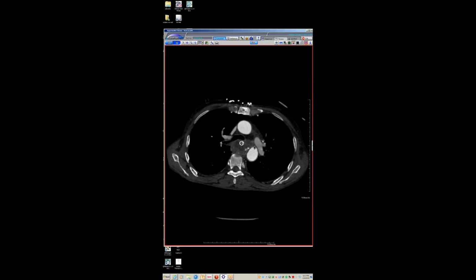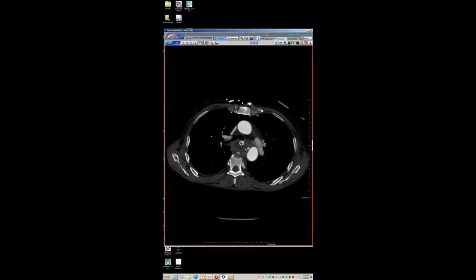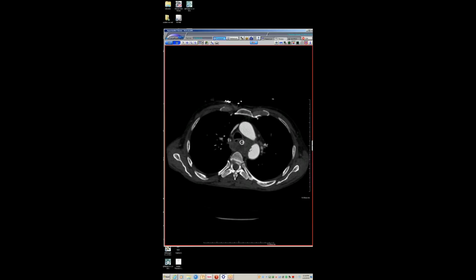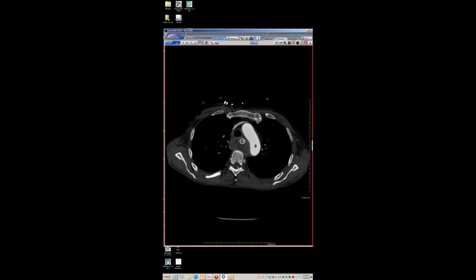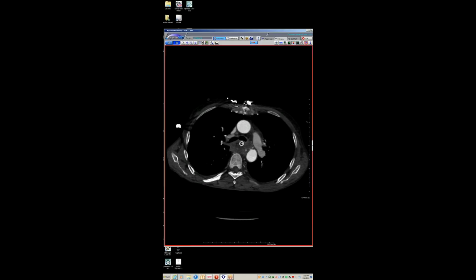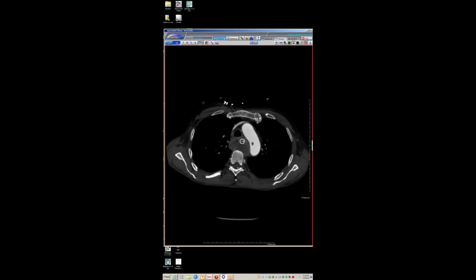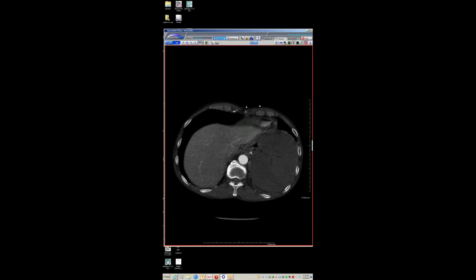Now, this was not a bronchial, so I won't spend time on it, just for the sake of time. The bronchials came off at a different point on the prior study, and this little soft tissue here was new along the medial aspect of the aorta, contiguous with the mass. The patient was never radiated. You can see the stent's really not in this location, so the concern was actual tumor ingrowth into the aorta. I don't know if that's true or not, but it kind of looks irregular. And then there's this just tumor eroding through the wall of the aorta, presumably, and then fistulizing with the esophagus. So that's an aortoesophageal fistula, and the patient unfortunately died about an hour after the exam.